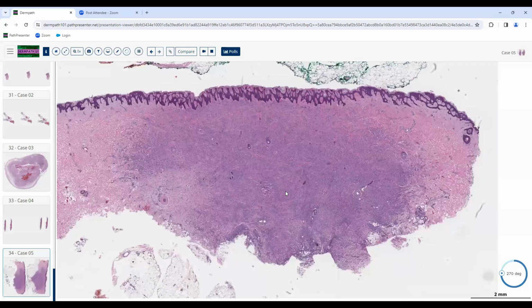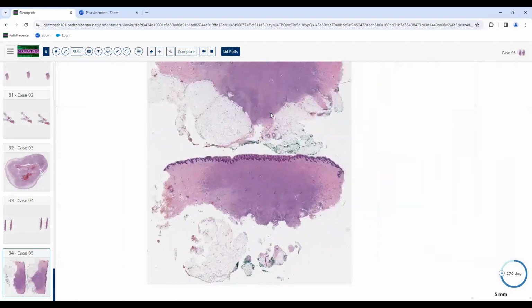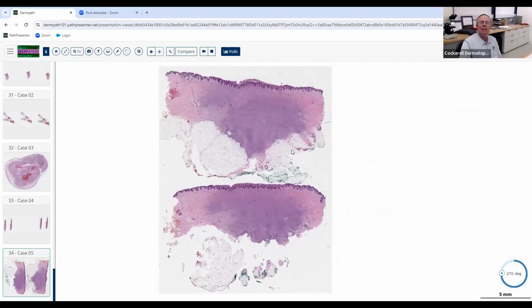So this is a nodular lesion, and it looks neoplastic. It's somewhat circumscribed. I can kind of make it out, but the borders aren't very well defined. It's not encapsulated. It seems like they excised the whole lesion, so it seems like they got it all out.